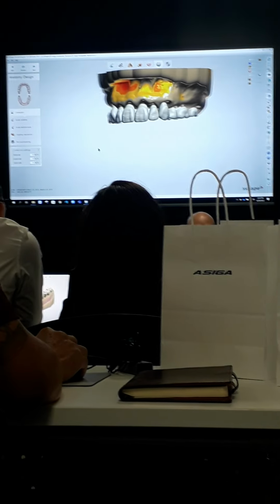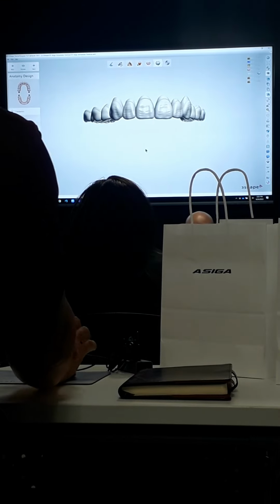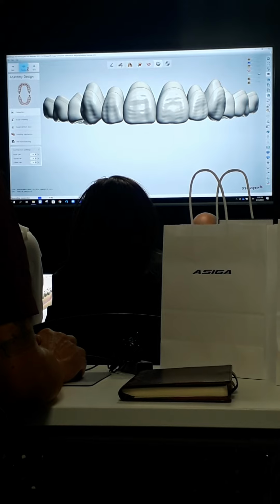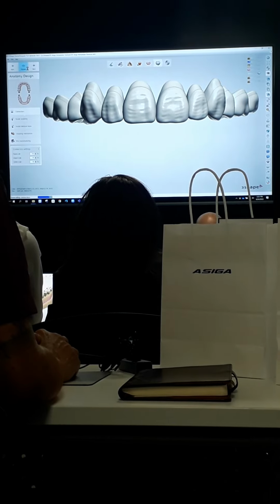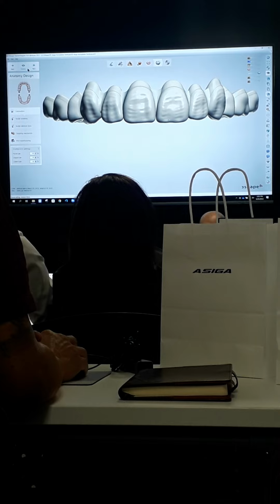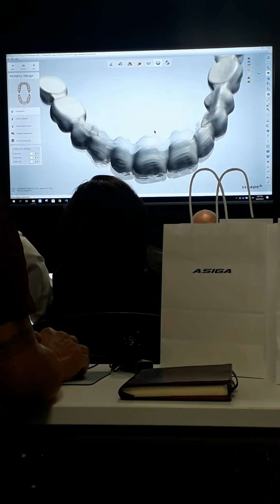I'm going to turn off my scans so I can just see the teeth there. Then I'm going to hit the preview button so you can see what the connectors actually look like. These generate more automatically than our crown and bridge connectors, so you're not positioning an outline on each individual tooth and then shrinking and sizing the inside. This is how they generate.